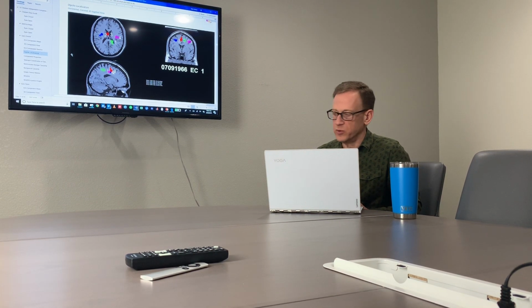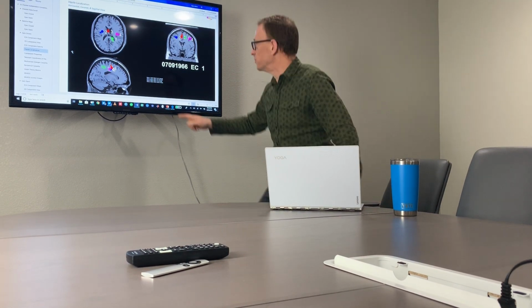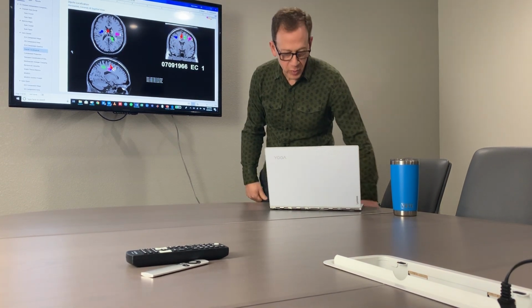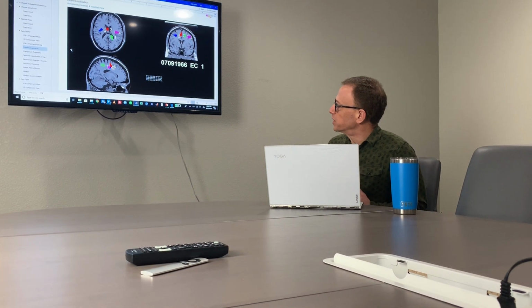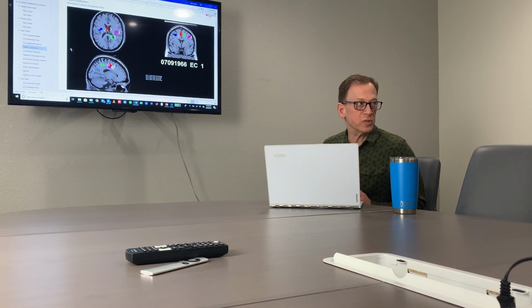And we can then take the dipole localization of where those are coming from in the brain. And even though we saw the activity that one of them was in the back of the brain, the source of it is all over the middle central part of the brain. Those are areas actually deeper in the brain into the temporal lobes and the limbic system. And what do those control? Well, they're most important for controlling emotional regulation, social interaction, and memory functions. And that's essentially what she's coming to us for.